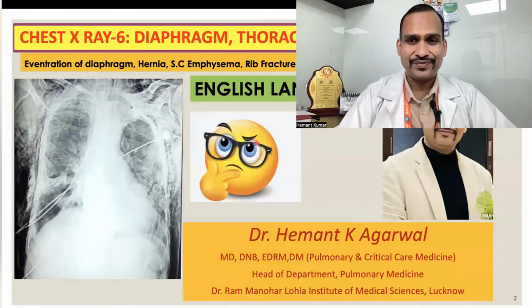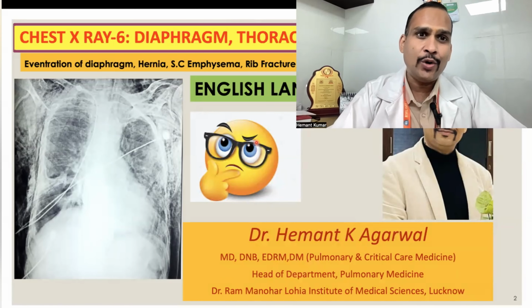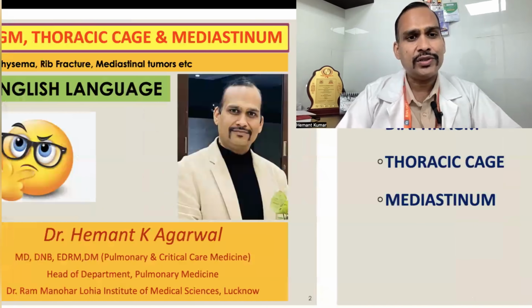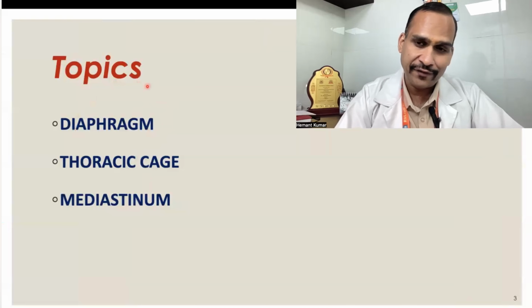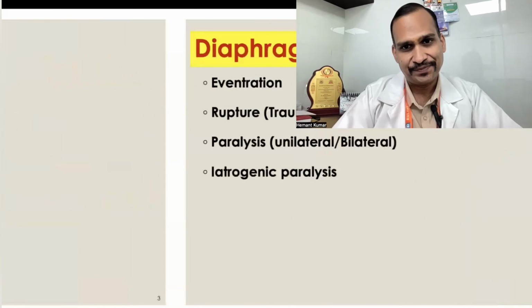Hello friends, in this series of X-ray, we will discuss our sixth lecture. In this lecture, we will discuss the X-ray findings of diaphragm, thoracic cage, and important mediastinum.